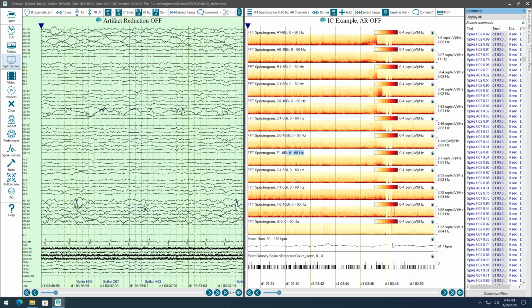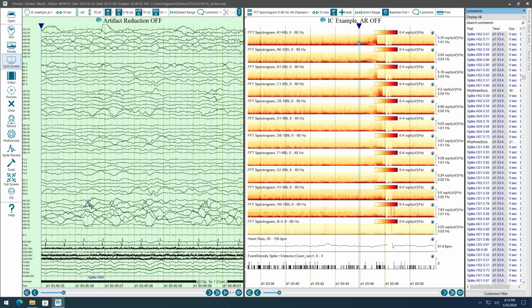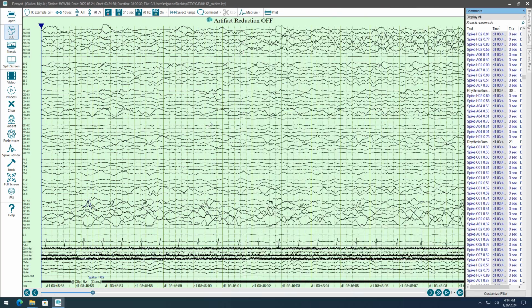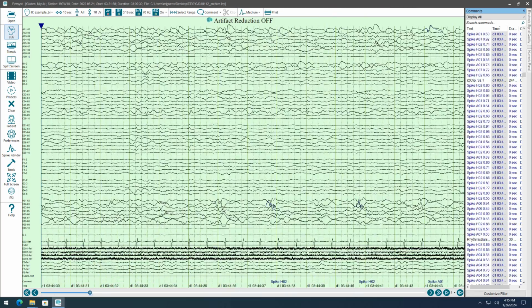And these are organized by hardware group, and we see that the onset in the earliest set of hardware is at around about this point, and then the onset's a bit later for other pieces of hardware. So let's say we want to capture the earliest one. We can use the trends to help navigate around in the EEG. We can go to a full page, and we can page forward and back and go, all right, where do I want to set the start of this?